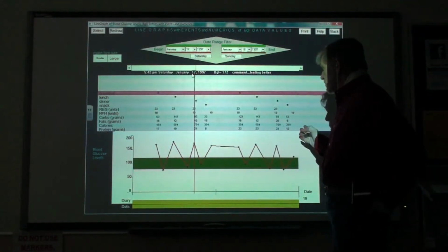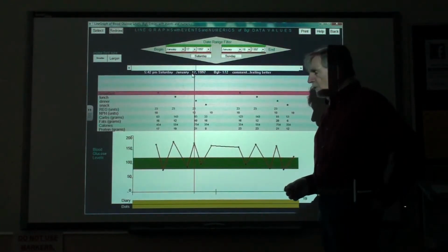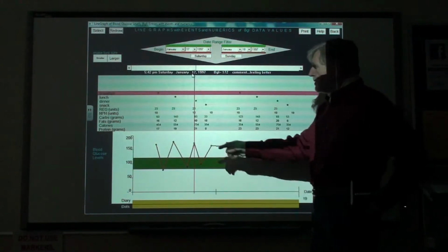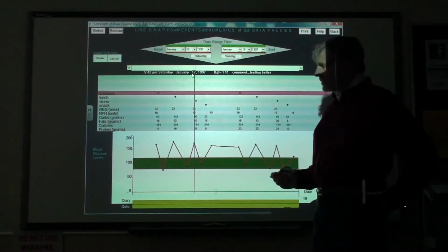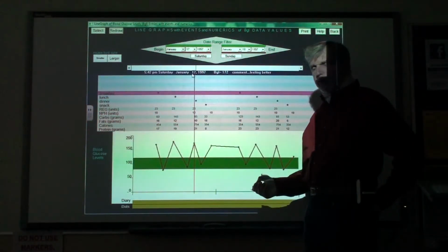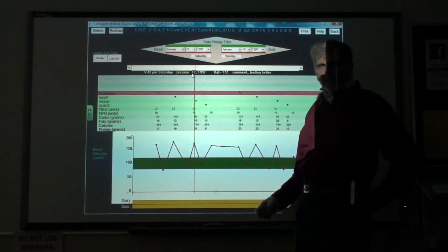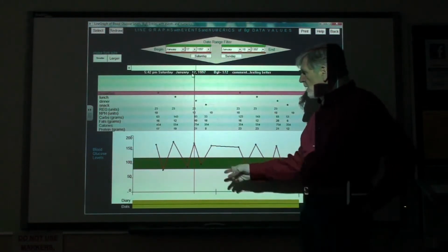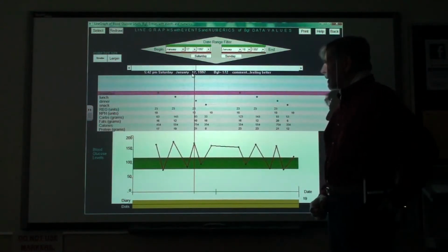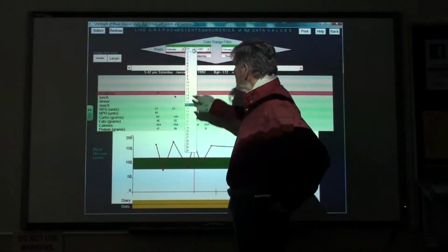Now, their food items are right as they should be. There is no over or under on the food items. So their food items is not causing these high readings. What is causing these high readings is insufficient long-term, because the short-term is acting as it should to reduce the reading, but in a few hours the short-term has worn off. And then it's the job of the long-term insulin to keep the reading down until the next short-term injection, but the reading is going back up. So the conclusion here is to increase the amount of NPH long-term insulin. Let's look at the next item on 21 and 22.